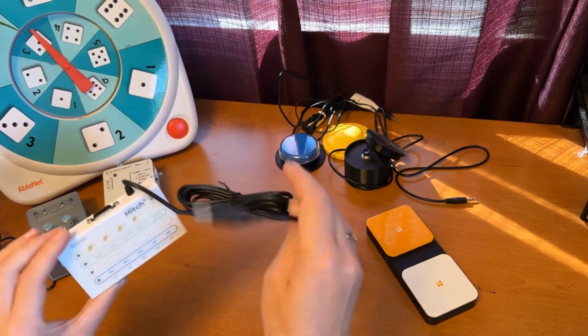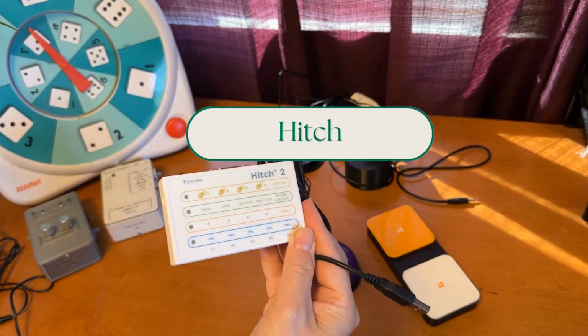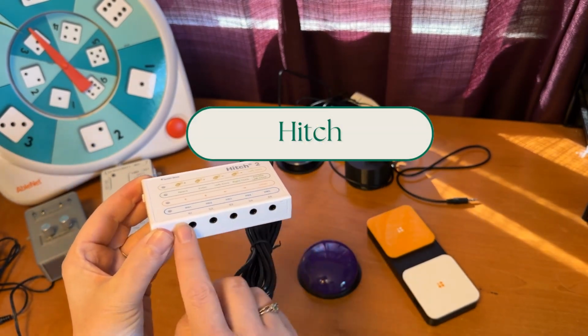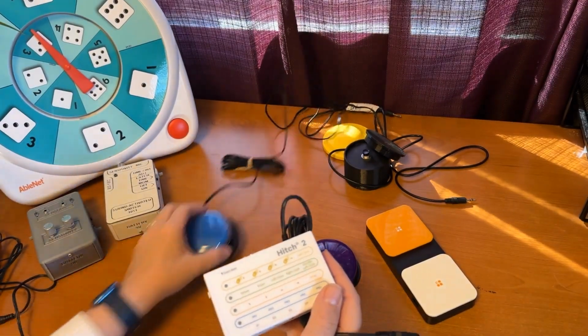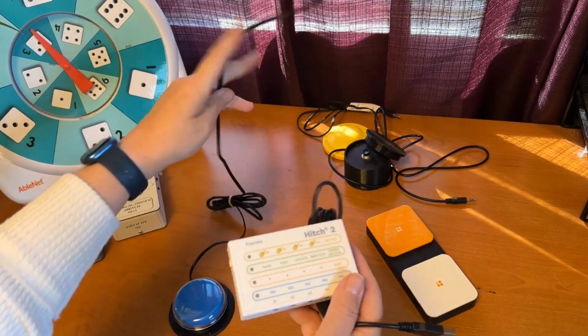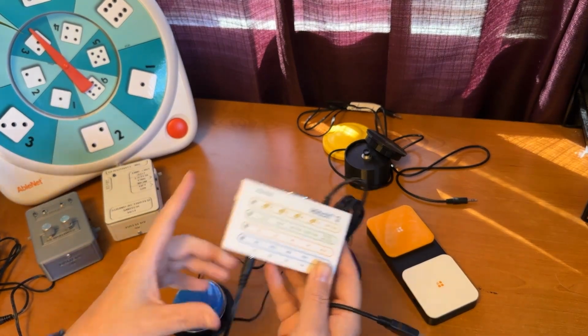Just like that, this is another version of a USB. This is actually a hitch. So what this does is allows you to plug a switch into this. So this is not a switch itself. This would get plugged into, for example, switch 1 down here.